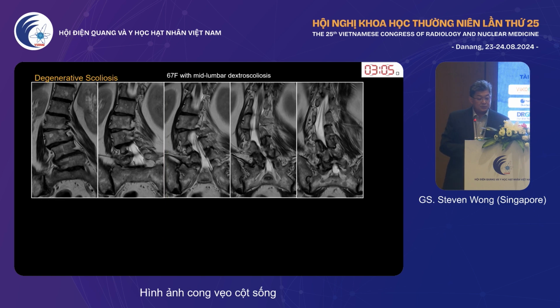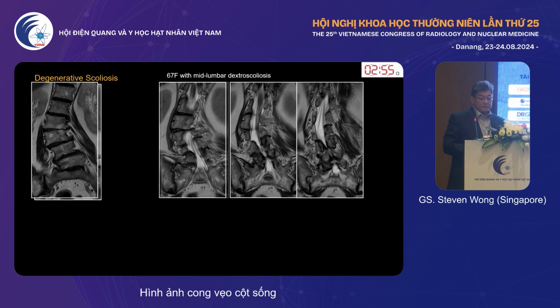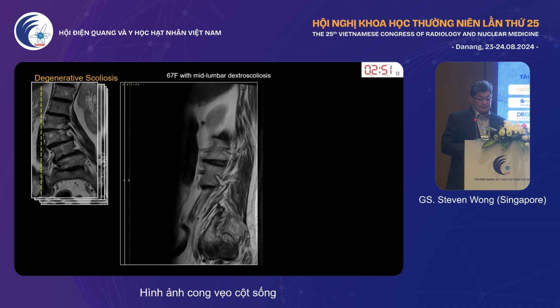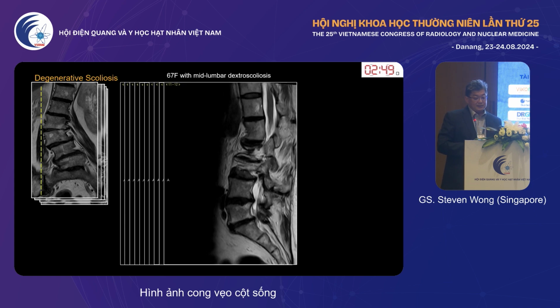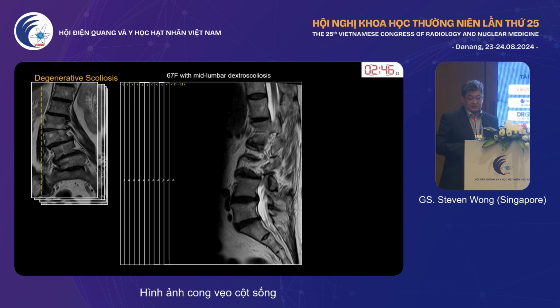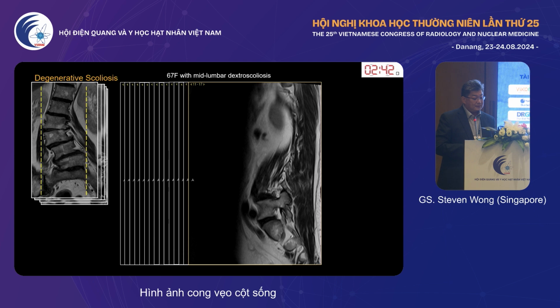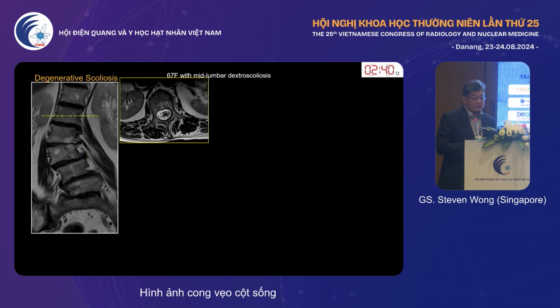So for this patient, I would advise that when they come for MR, you do a coronal MR sequence. Let's move on. So that's my answer to using a cine loop. I just fade them in. In the interest of time, let's skip this.